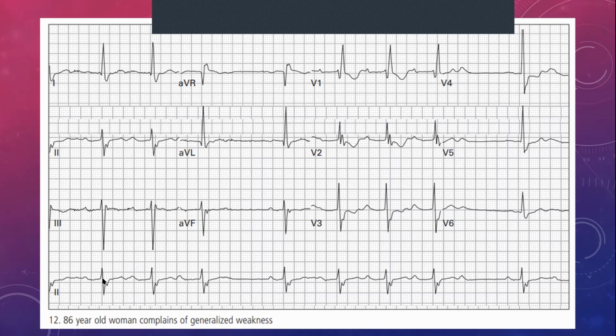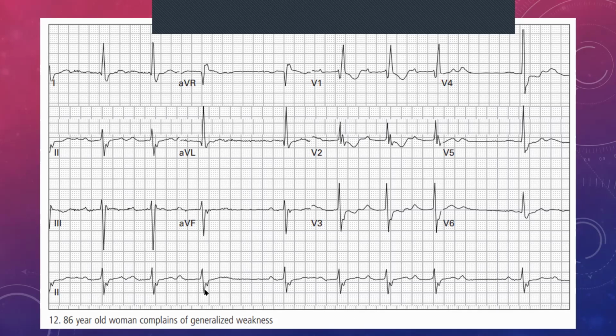And if we look at our QRSs, do we have a QRS following every P, which means does the ventricle contract every time that the atrium contracts? And I think the best place to see it is probably here, where you see we have a P wave and then it drops. No? So we've got a heart block.